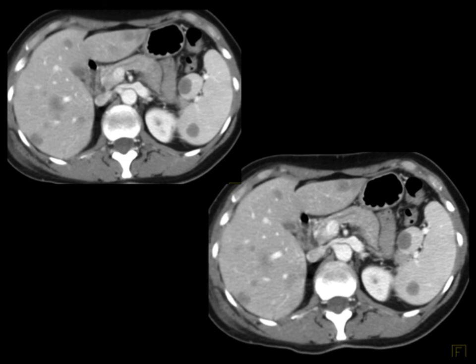Now, when we think about tumors and we think about different processes, we also think about what things involve unilateral versus bilateral. And I mentioned before, a lot of the things that are unilateral, most of the time can be bilateral. There aren't that many things that can't be bilateral. And so you just mentioned four: lymphoma, mets, infection, sarcoid. They're all bilateral, so it's not going to help you in differential diagnosis. But there are some other findings, and let me address those.